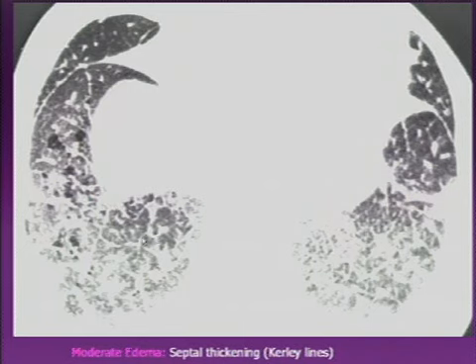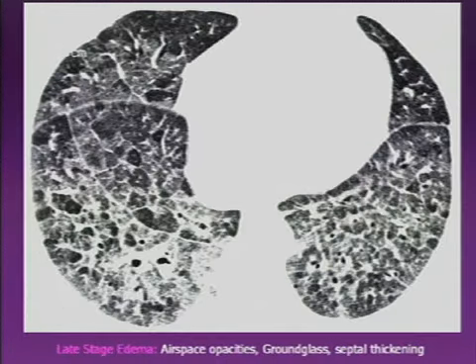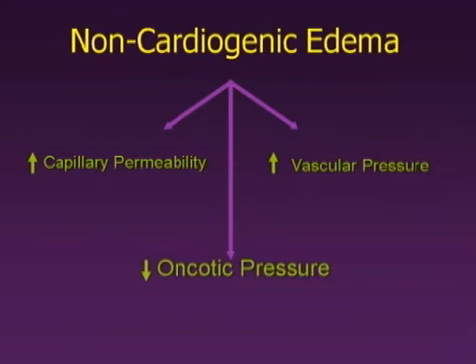With moderate edema, we see more interlobular septal thickening superimposed on the ground glass densities, and at this point we start to see pleural effusions. And this is a chronic edema. This patient has interlobular septal thickening and diffuse ground glass throughout the interstitium. This patient had long-term edema.